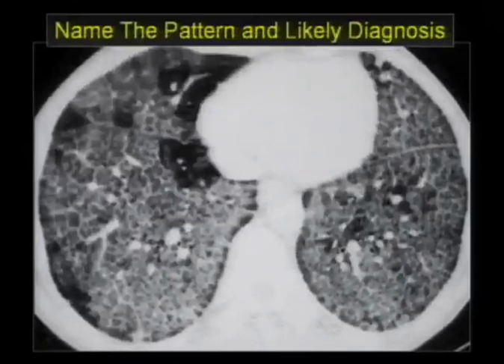What do you think this pattern is? And if you can characterize it correctly and name the pattern, that should engender a fairly limited differential diagnosis with one entity leading the list.